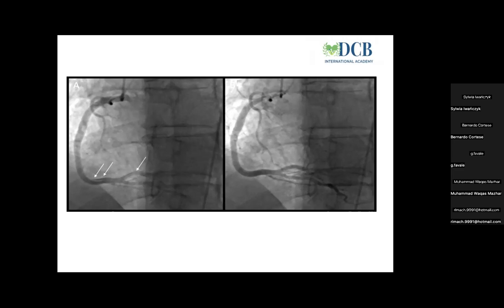Okay. So in this case, as shown, we see just a dissection in the distal coronary artery in figure A, although we cannot see it after the second injection. So this is an artifact, because with the second injection they did a good injection in the RCA and we cannot see it afterwards. But it could be an artifact, but how do you explain that white filling in the mid part, and the vasospasm approximately?